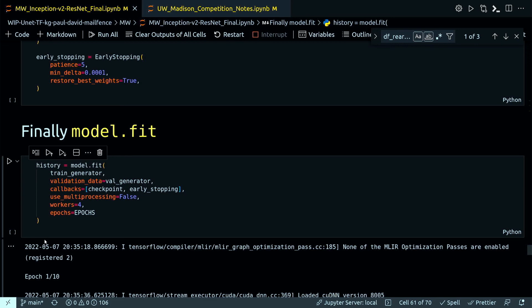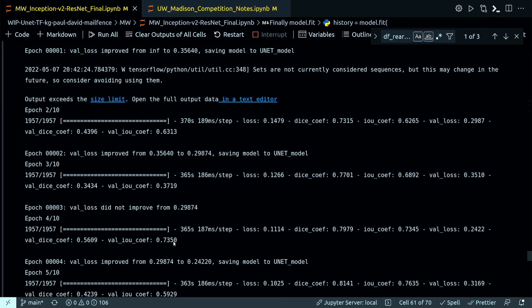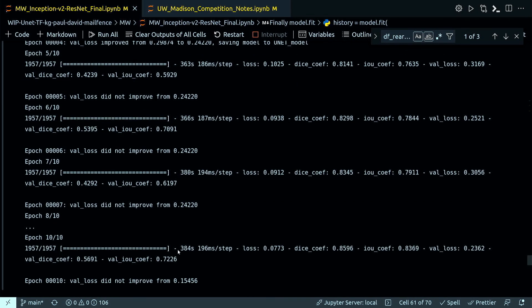And then I started training, and I only ran for like, I think 10 epochs. And at the end of 10 epochs, my loss figure was actually showing promising numbers. So let's see.